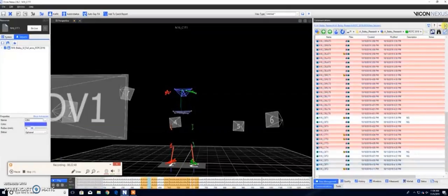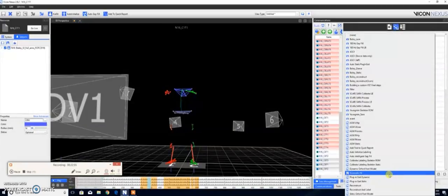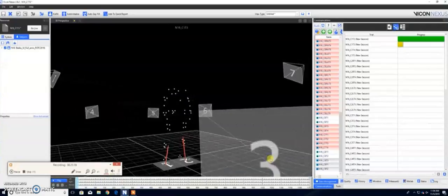And we can come over and split this screen a little bit, and we can bring those files all over on the side, apply a reconstruct pipeline, and then that is going to, we call it batch processing, do all of those files that we selected over time. It's going to run through those without us physically having to go through each one.